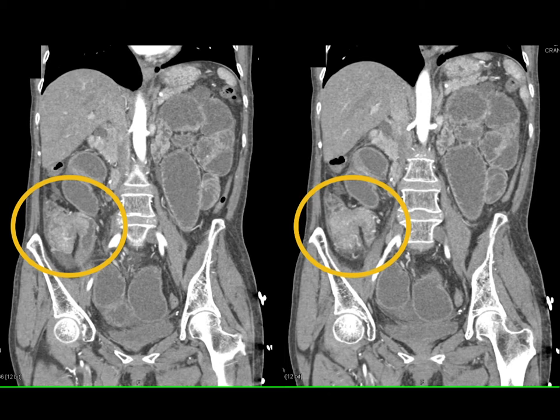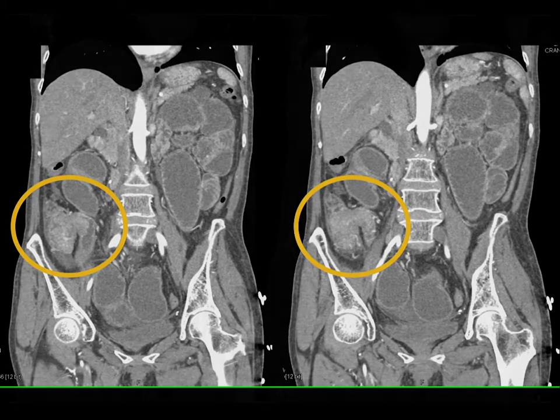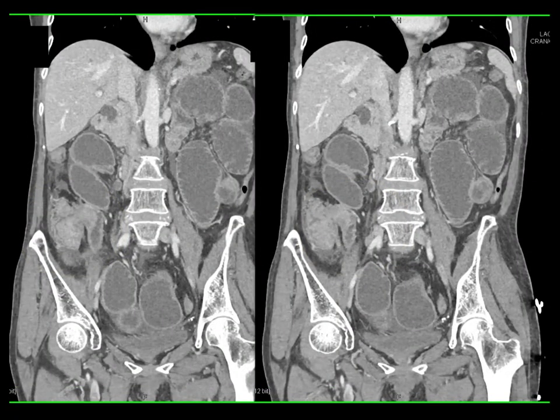When something crosses the cecum and ileum at that ileocecal valve level, you've got to be thinking about lymphoma. And this was lymphoma. A very, very nice example. This case also makes the point why water is such a good contrast agent. You can see the enhancement, although it's not significant, of the mass, and it stands out really nicely against the fluid-filled bowel. Very, very nice example.